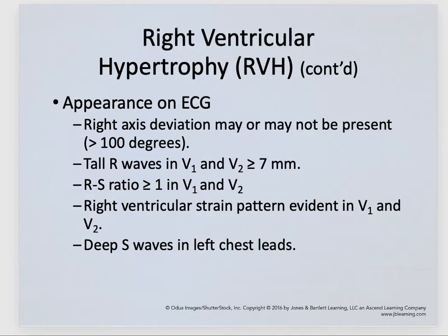Think about that. That makes sense. The thickness of that ventricle has gotten wider. There's more cells for it to contract through. So right axis deviation may or may not be present.